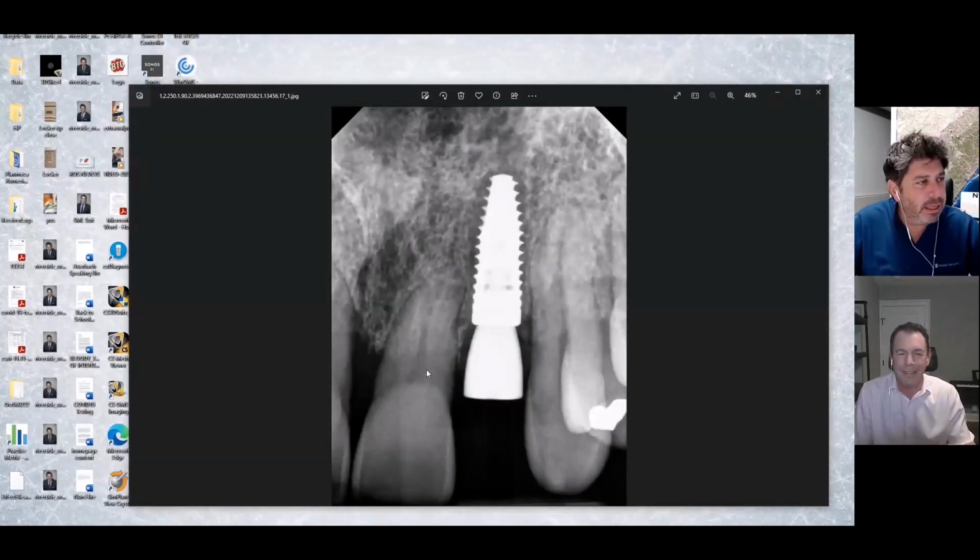So this is the immediate post-op periapical film. You don't know this, but the implant was placed freehand at the same time the tooth was extracted. It emerges exactly where it needs to, and it's currently integrating, and we're slated to see this patient pretty soon for his post-op. I noticed that you mentioned it was placed freehand. You're saying that with a little bit of swagger? Just a little bit.